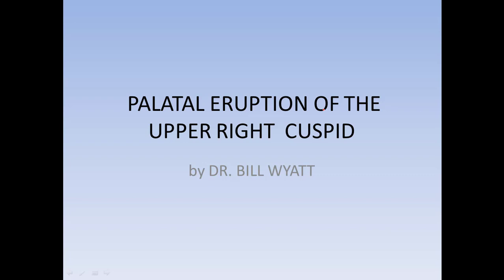Bill Wyatt again with the American Orthodontic Society, and I'm going to record a short video here on the eruption of upper right cuspid into the palatal area. Normally this happens on the labial side rather than on the lingual side. But this time it's happening on the lingual side, right in the top of the palate.